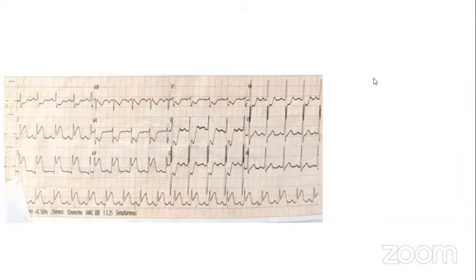Tushar, rather than patient counseling, I need the treating physician's counseling. No, exactly, because this ECG is not only inferior, but it also hints something grave. And also look at the amplitude, because of the degree of the ST elevation. But my point is that you have the patient in front of you. How does the patient look? Is the patient hypotensive? Is there any murmur? Is there any shock? Predict this, because it may already be in a bad situation.